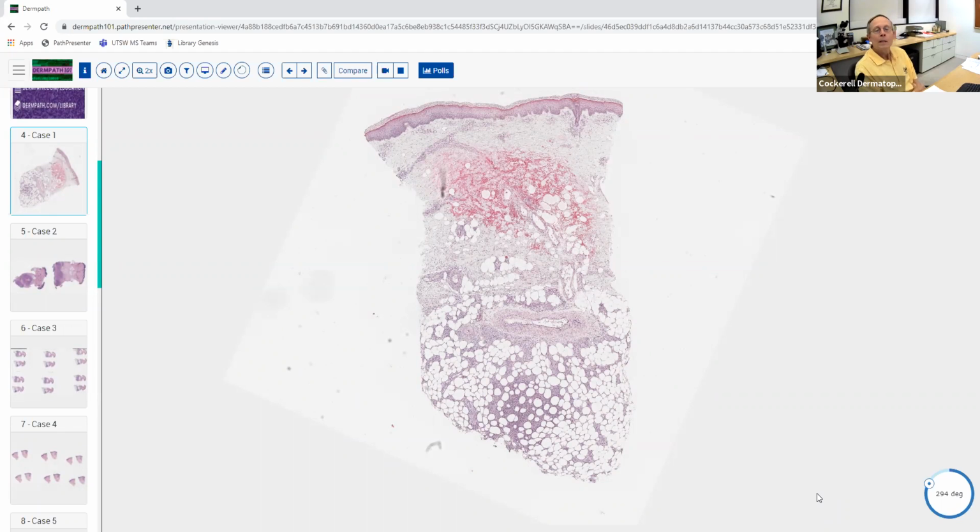Good, excellent. So panniculitis is pretty logical when you think about it. If you have your systematic approach, you say, was it lobular or septal mostly? And there can be overlap between those two, obviously, but that's the first thing you do. And then you ask whether you see vasculitis or not. And in order to really see vasculitis involving the larger blood vessels, not really the large blood vessels like we see inside the body cavity, but they're larger than the capillaries and venules that we see in the top of the dermis and the papillary dermis.